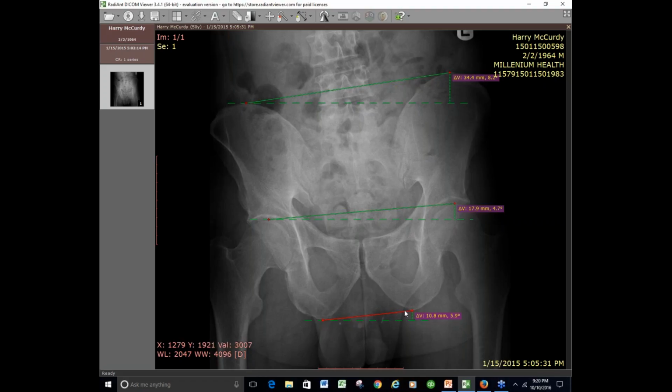And when you subtract that 5.9 degrees, this thing's going to drop way down. And then the question is, how much do I have to lift him to get the real difference in here? That's why I need this bottom angle to match the top angle. And then I just need to figure out the difference between where they are now and where they ended up.